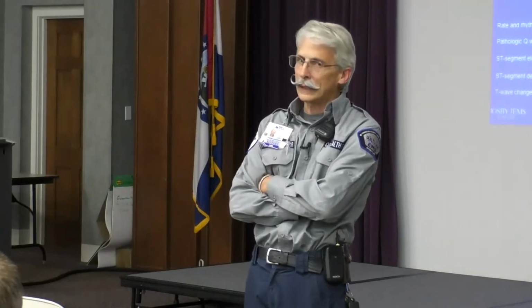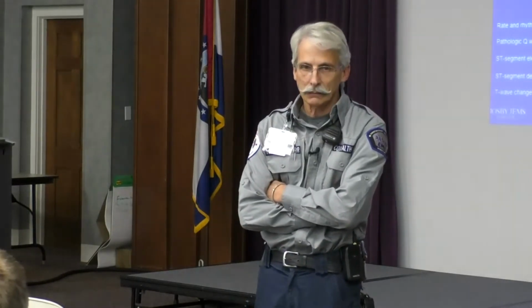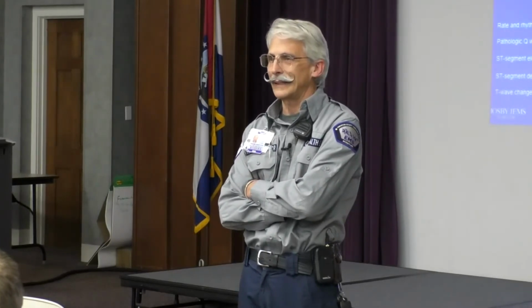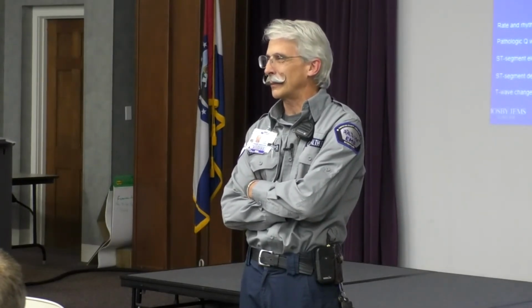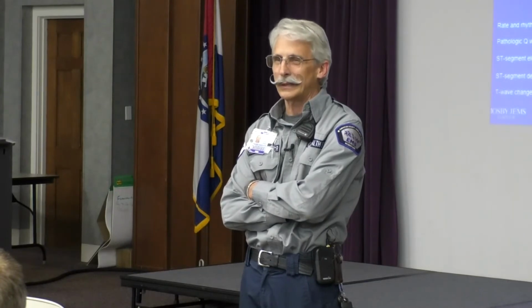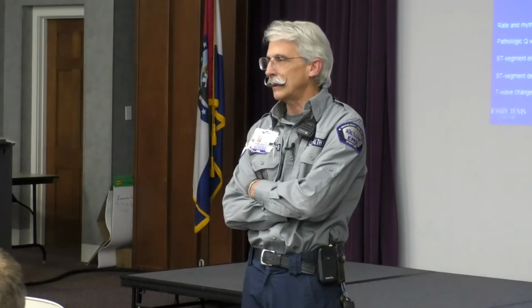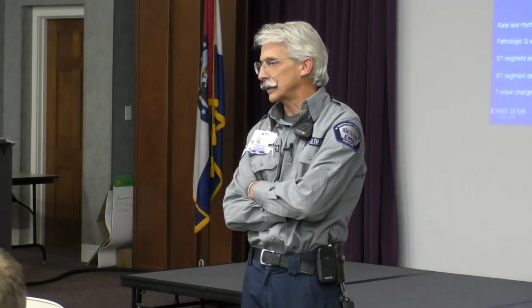Not necessarily negates it, but it sure makes me question it. We used to teach that if you've got a left bundle branch block, just forget it. Just treat the patient, because it's only important in certain circumstances.